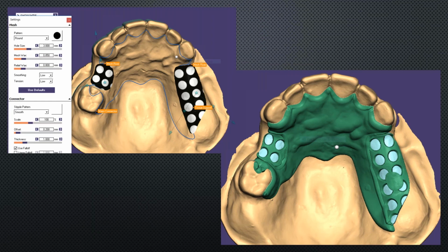You could even be as much as 1.8 just in that area, just at that lower, because the tongue gives a lot of space in that area. And then when you go up to your apron, then you'll be down to like 1 millimeter thick, because there's usually less room there, and that works out pretty well.